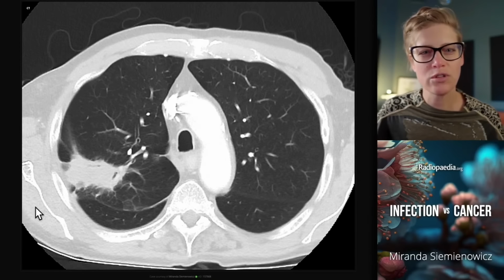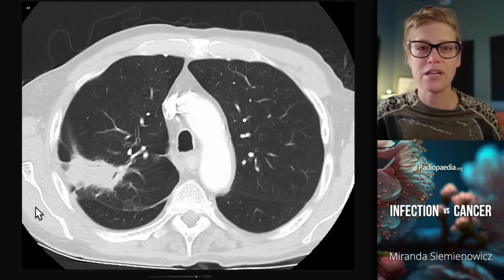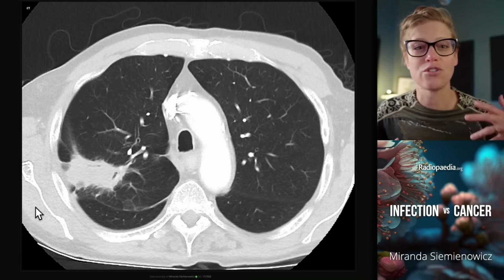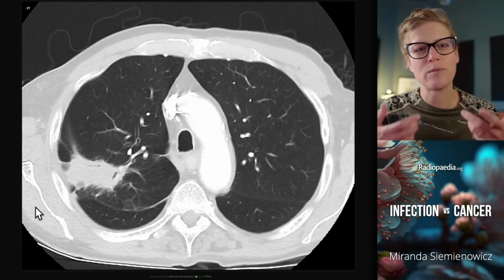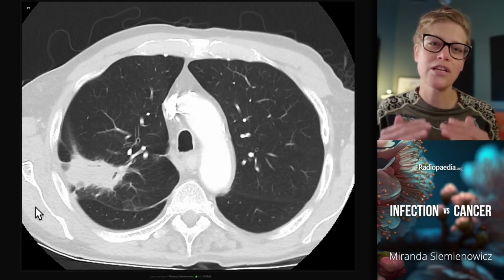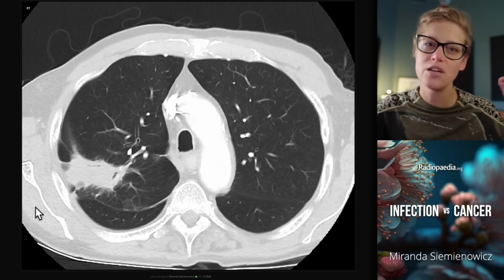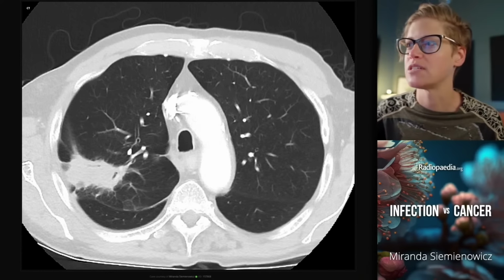So when you have pneumonia in the lungs, you remember from histopathology that we start with red hepatization, with progression through to grey hepatization and resolution. So the red blood cells that are in the inflammatory exudate are consumed, fibroblasts lay down fibrin, which is resolved by macrophages. And as the whole lesion resolves, what we see radiologically is these concavities with organization and retraction as part of that organization and healing process.